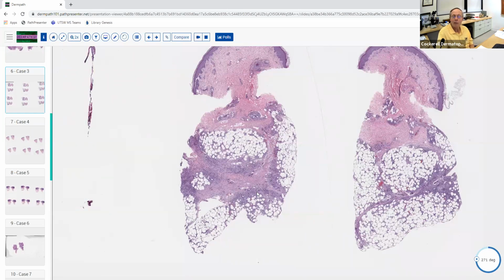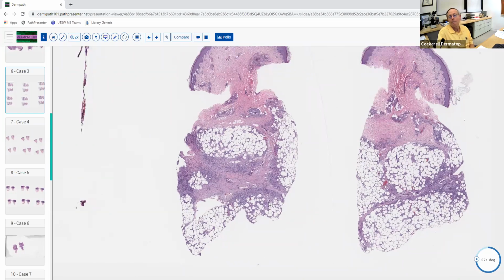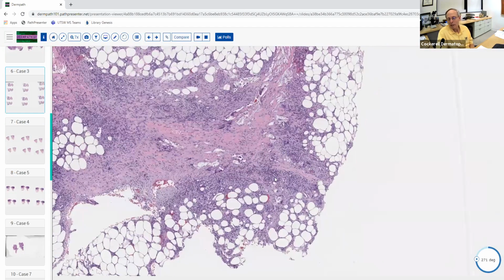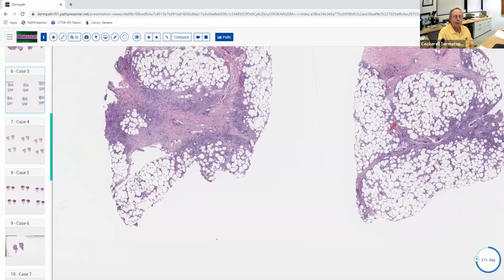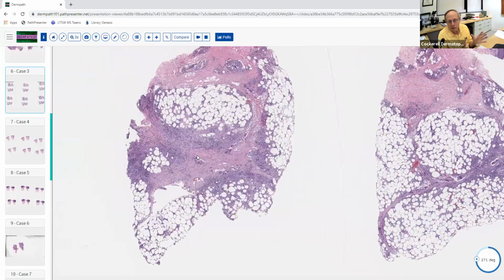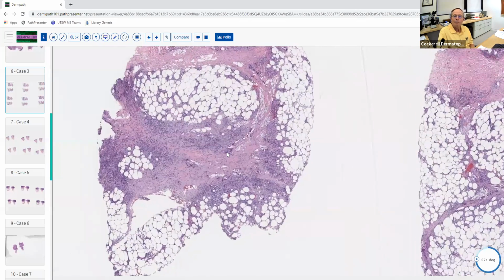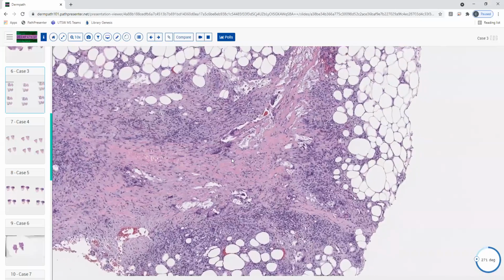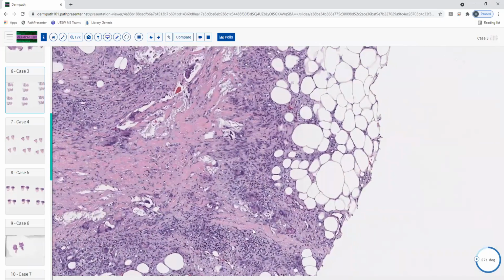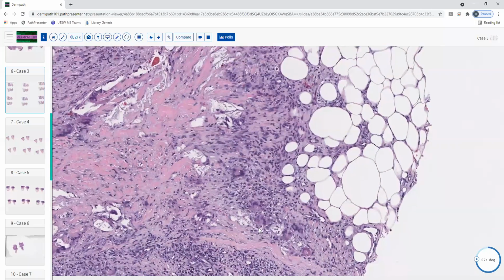Now, one of the things we talk about is septal versus lobular. It's really septal mostly, because you can see it does spill out into the lobules. But when you get septa that are involved like this, that's clearly the pathology, so the lobules are getting involved secondarily. And then what kind of inflammation is in here? So this level looks probably mixed because I'm seeing some darker cells. I am seeing some giant cells as well.